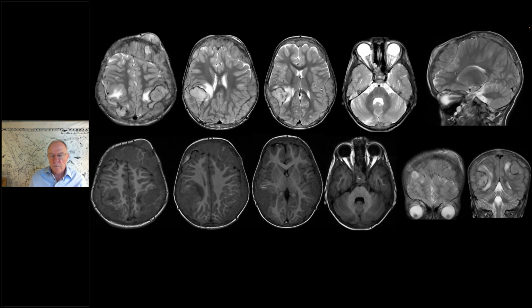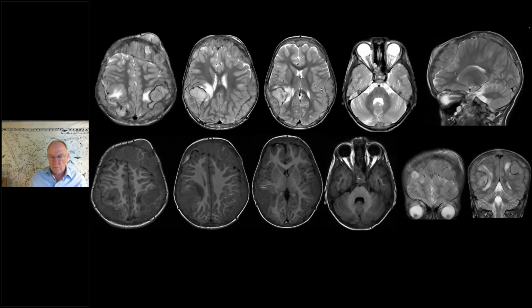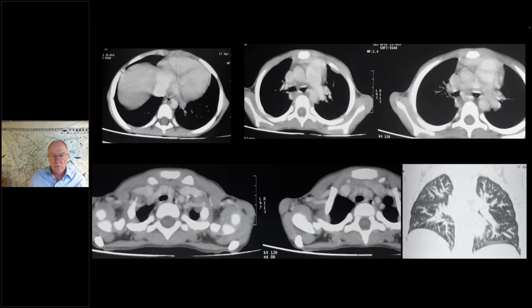Nihaal, both me and you are not chest radiologists, but I wondered about the coronal CT of the chest. That doesn't look normal to me. Yeah, it's not normal. It's quite a diffuse process of something going on there. Some ground glass opacities are there on both lungs, and bronchiectatic changes, and if we start looking at those as nodular changes or tree-in-bud kind of appearance, I think he might have a systemic involvement.